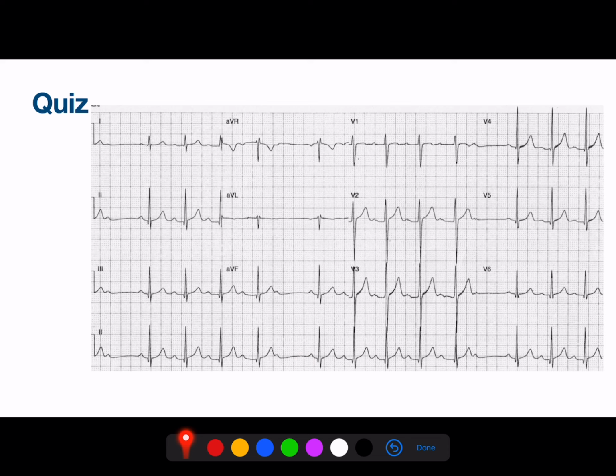So it's AV block second degree Wenkebach, because we see a prolongation of the PQ interval until one QRS is missing. But since the SA node is firing regularly, we have again the start, we have again a short PQ time, which is getting longer and longer and longer until one QRS is missing, and it starts from the beginning.